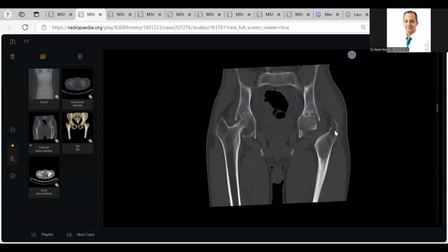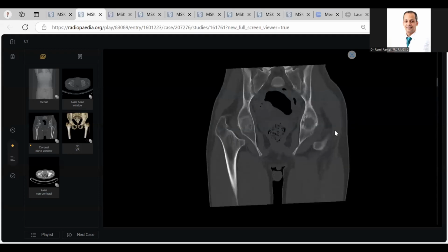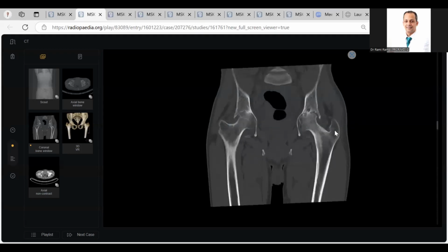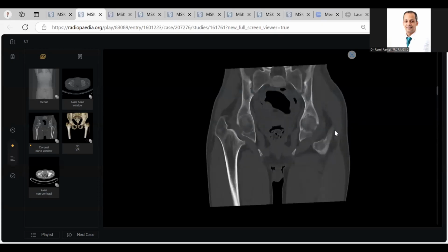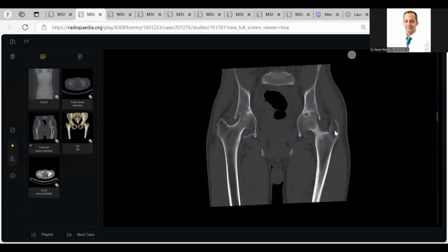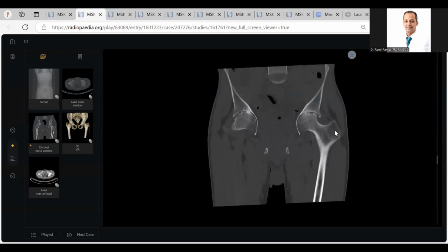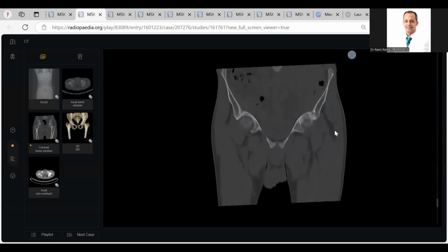It could be an inflammatory arthropathy, such as rheumatoid arthritis. What else? If previously there was an acute presentation, it could also be septic arthritis leading to destruction of the bones. What will you do next?